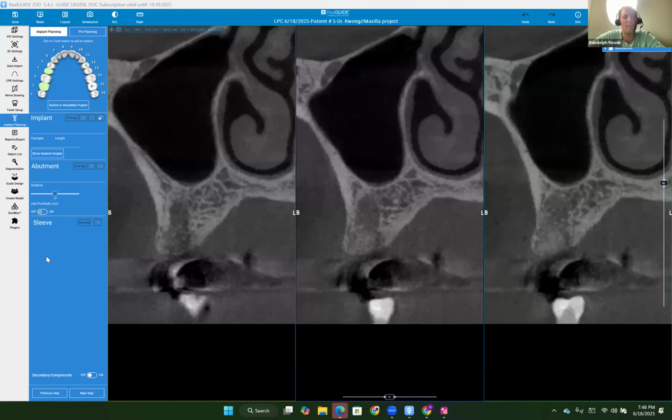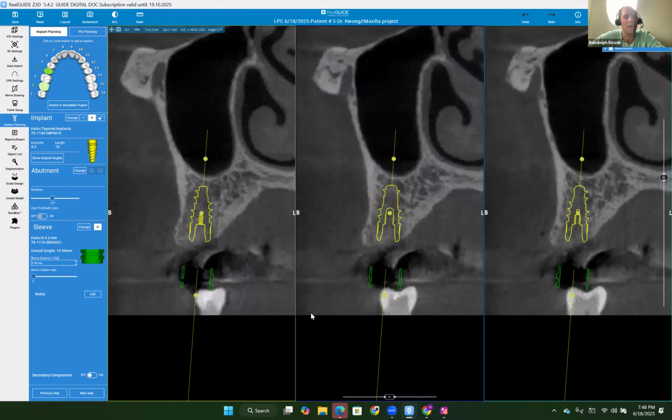And if you do have poor primary stability with your implant, I would not place the implant. I would go in there and really degranulate that out. You can even use a round burr to remove all that soft tissue and regraft it. It's mostly going to be at the apex, that soft tissue. So, other than that, you have good bone width and height for an implant there. I think you have a 4.3 by 10.